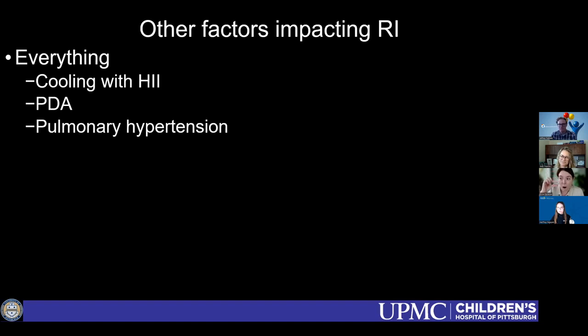And you'll actually watch the vasoreactivity, and you'll watch it come back to a normal Doppler, a normal RI. Or you'll see that there is no response to normal, and that's a child who is on the cusp of increased intracranial pressure, such that any additional pressure means that they're just going to have reversal of flow. So I think it's useful in very specific populations.